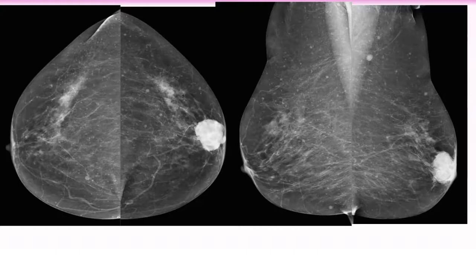Multiple neurofibromas, but they are not typical. No, I told you they are within the parenchyma and subcutaneous. So you have to think about something, and not neurofibromatosis. It is skin, a dermal lesion? No, this is not a dermal lesion. This is parenchymal and subcutaneous. Any suggestion? Metastasis. We have to think about metastasis.